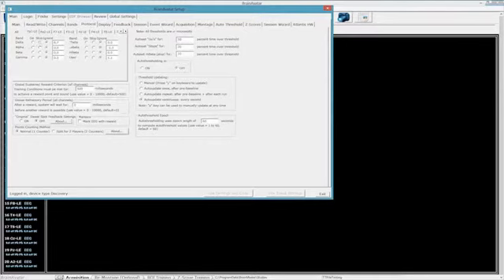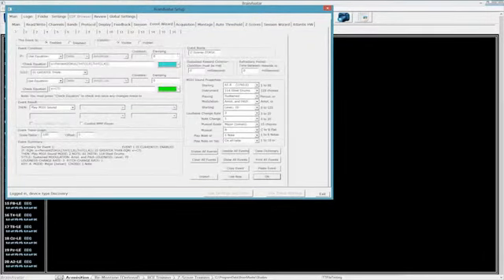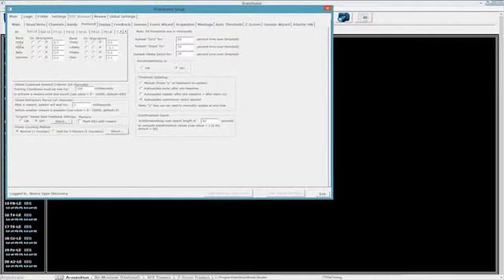So this delta go, stop, ignore. Think of that in your Event Wizard. The first if statement right here is your band. Right now we're saying x equals percent Z OK, train T1, 8, train T1, 4. That is if delta.